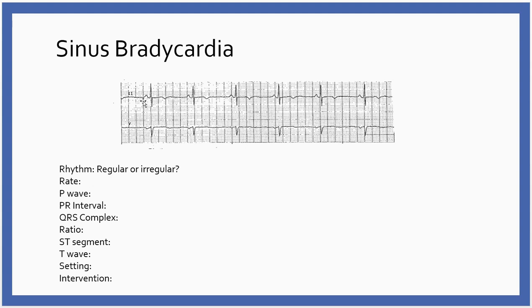All right, I'm going to examine my QRS complexes, and so that's these, and I have kind of a biphasic QRS complex, so these are my complexes, and they all look about the same. Same here. Here are my QRS complexes in the V lead, and they look about the same.